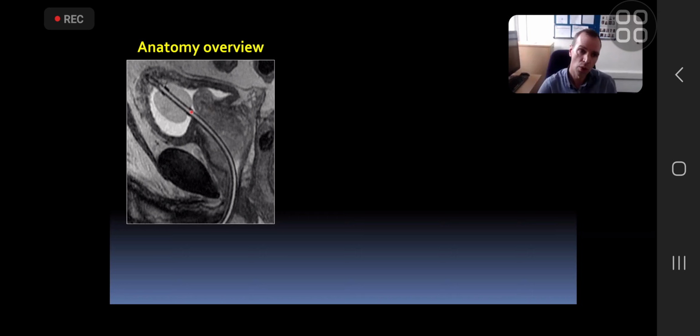The urethra we don't always see nicely, because if we think about axial imaging, it's cutting across the plane. So we're seeing it obliquely coming through the plane in our axial images, and we don't always see that with partial voluming. And by the time we get down to the apex, the lower part of the prostate here, we do see the urethra coming at us directly, so we have more chance of seeing it. We typically do see it at that lower part of the prostate.